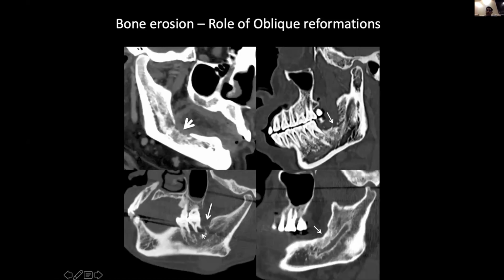However, if you compare this particular erosion, there is no sclerosis, there is a permeative pattern, and this is true tumor infiltration. And this is a very classical example of an edentulous socket, where you see that the sclerosis has come all along the socket and you are not seeing the tooth within the socket. And this is a classical focal depression when you have a loss of tooth.